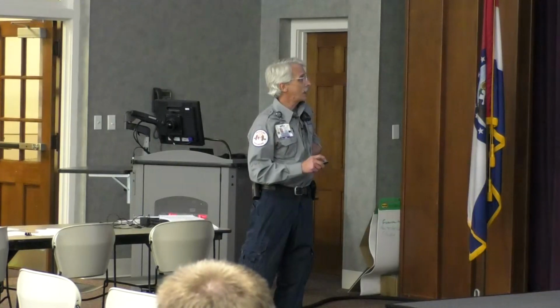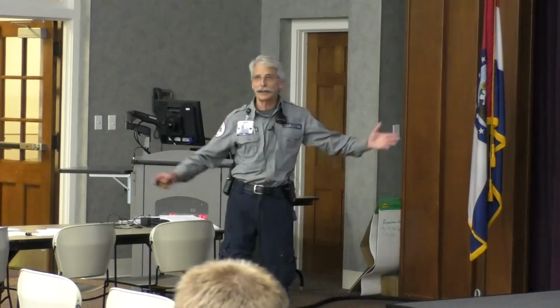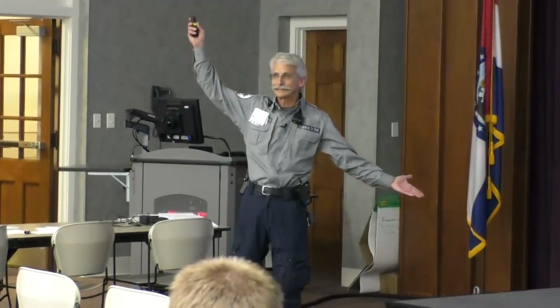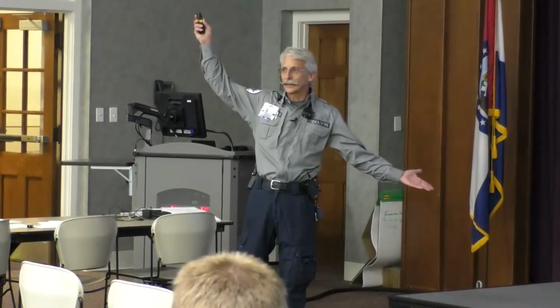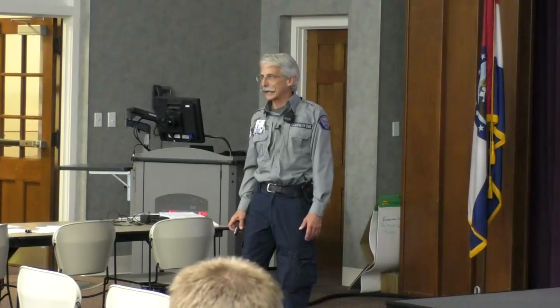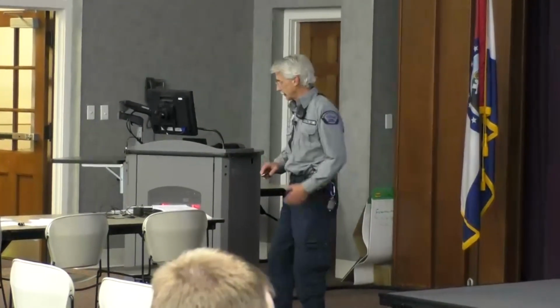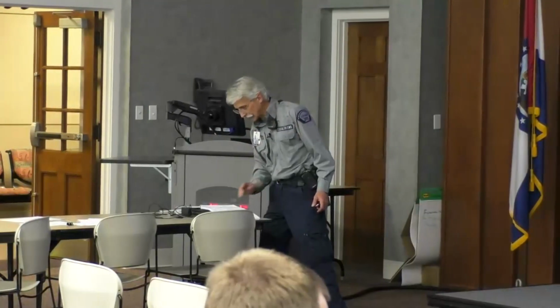And we also have reciprocal changes in 2, 3 and AVF, the other side of the teeter-totter. So this person's showing everything all over the place, and they have the widowmaker going on, a global MI. All right. Let me see what the next one is.